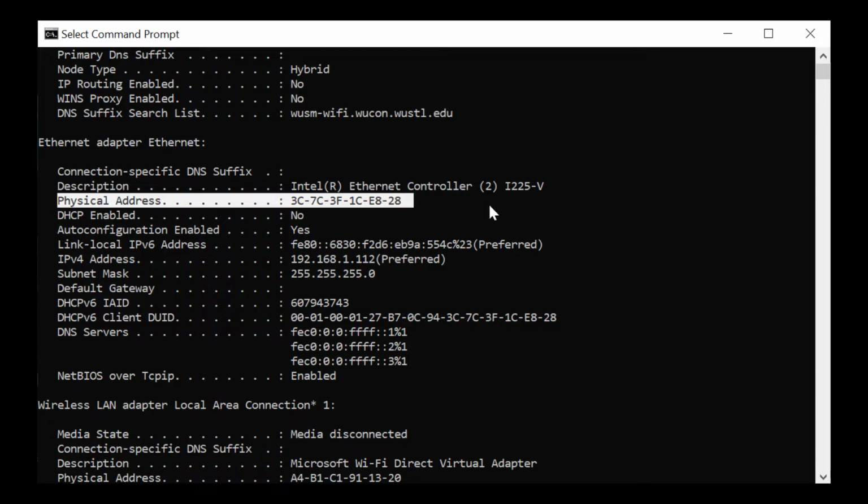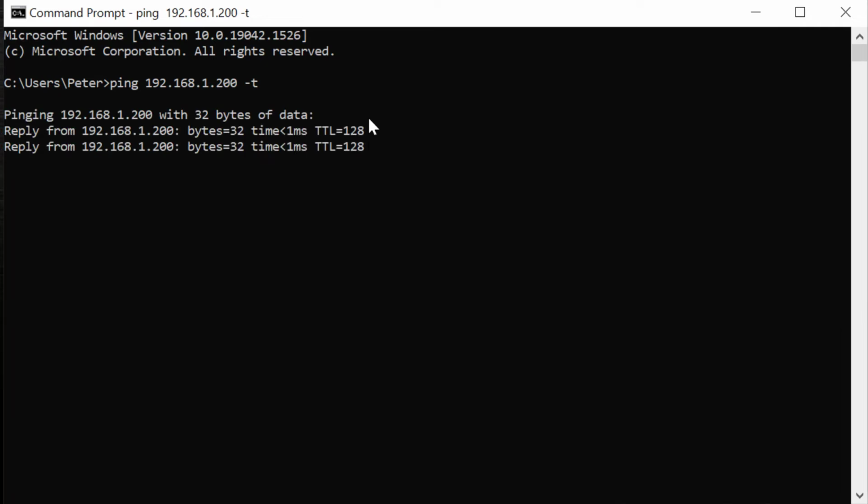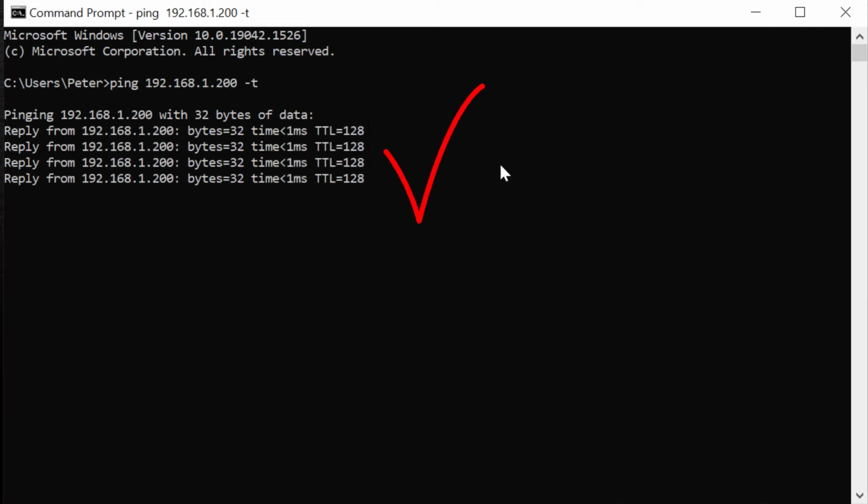For now, to confirm that the 2 systems are connected, try pinging the IP address of the Neuro Omega. If there is no response, make sure the Ethernet cable is connected and the mentioned addresses have been changed as specified.